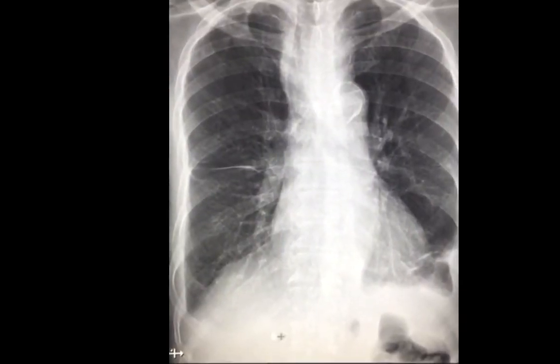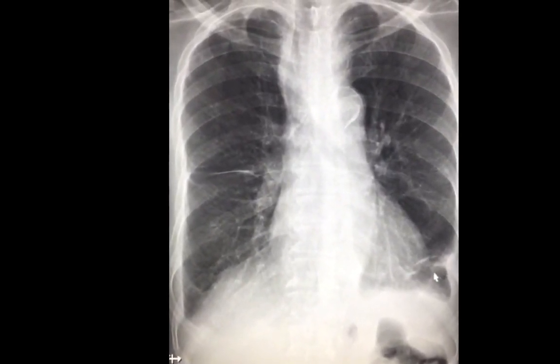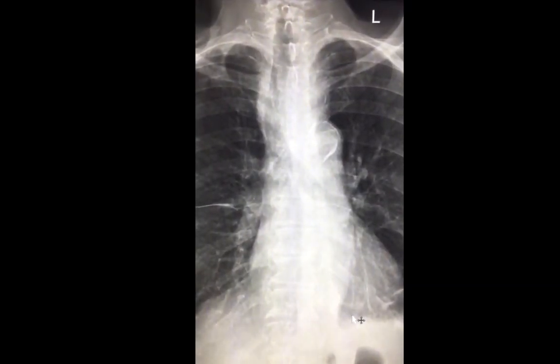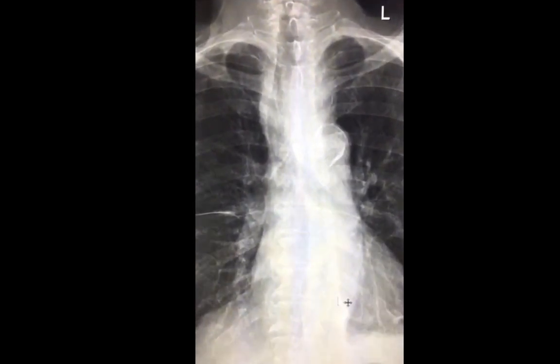You probably have noticed the bilateral pleural effusions and are questioning these linear opacities as either scarring or atelectasis. However, don't let the obvious abnormalities distract you. You should always look at hidden areas on every single chest radiograph.